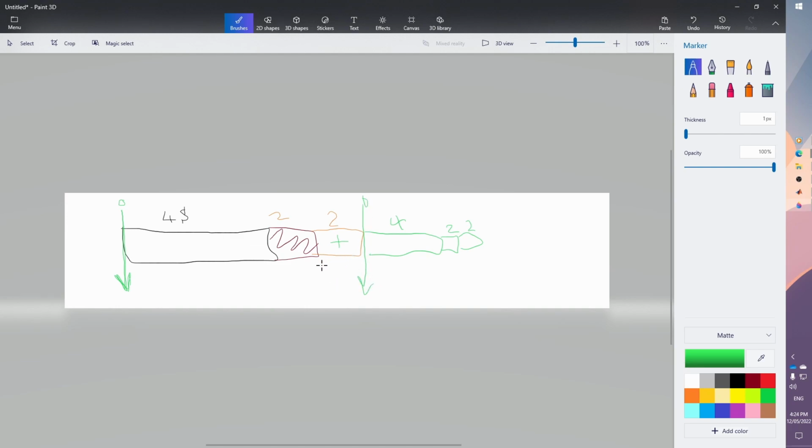between different trials. Okay, so what is really interesting in this part is that let's imagine we are trying to analyze our EEG data, and we are trying to see the difference between the motor imagination of the left hand, what will be the response of the brain for moving the left hand or imagining moving the left hand, compared to moving the right hand. So that's exactly what we are trying to see with this dataset.